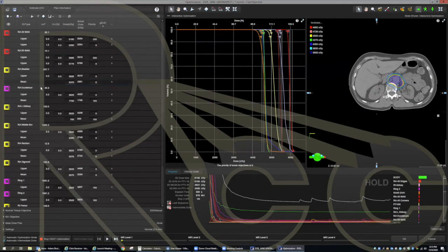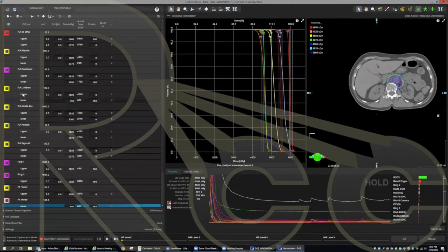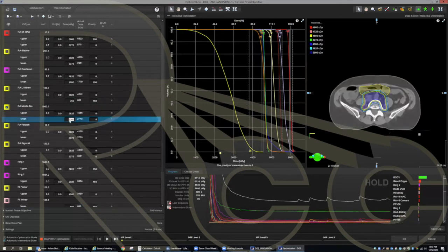Okay, so let me move to some other organs at risk. It's going to take me longer because I'm talking so much again. So I'll move a little bit more inferiorly. So let's do this middle bowel. Look at that. 2400. Again, all of them at 150.